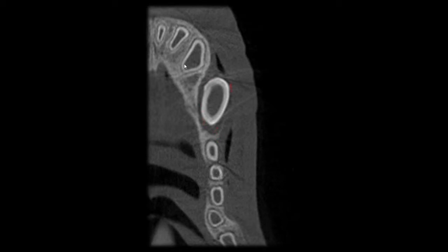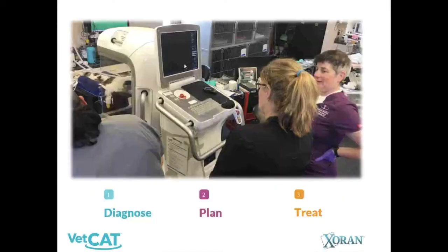And in this canine tooth area, we might think that there are some sort of periodontal pockets on the palatal aspect of this canine, but in fact, we're looking at a cross-section that is more coronal than the bone level, the crest of bone. The way to know this is to look more carefully and recognize that we see enamel, meaning that we're more coronal than the cemento-enamel junction. We're not at the root level, and we don't expect bone to be in contact with the enamel. So this is also normal.